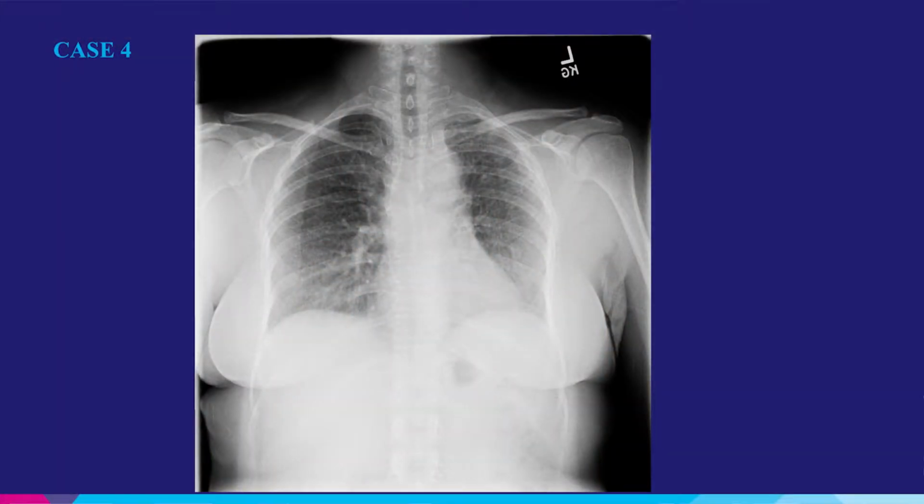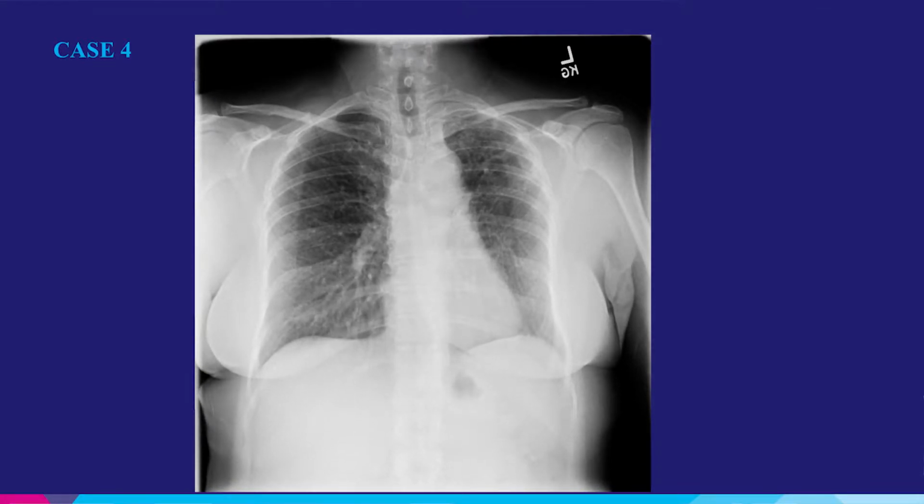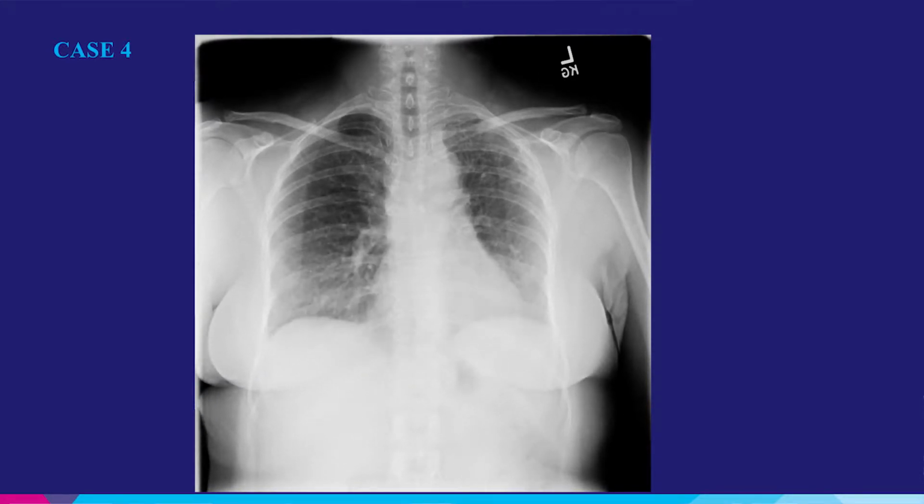And again, that goes along with the total lung capacity of less than the lower limit of normal. This patient had some shortness of breath, and we were trying to evaluate why. So the big thing from the get-go is the left thorax has loss of lung volume on the left compared to the right. She has good diaphragm excursion during tidal breathing.